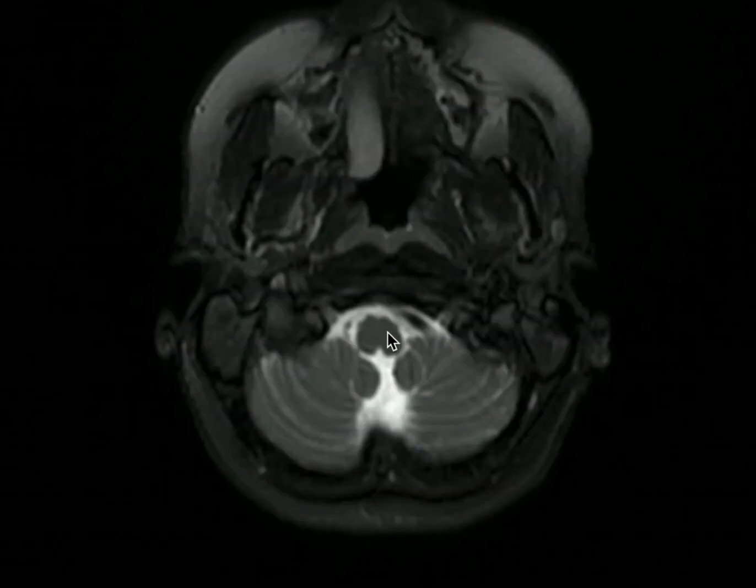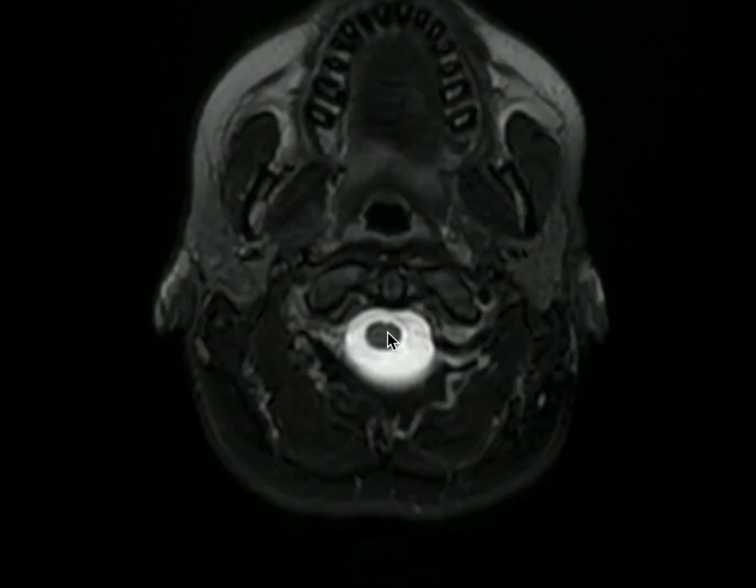This will be right here, and as we scroll down, I'd like to point out the important ligamentous anatomy, starting right here at the level of the dens or odontoid process. This ligament right here is the hypointense structure extending from the medial margin of the lateral mass of C1 on this side to the medial margin of the lateral mass of C1 on the other side. This is the transverse ligament, which is a component of the cruciate ligament.